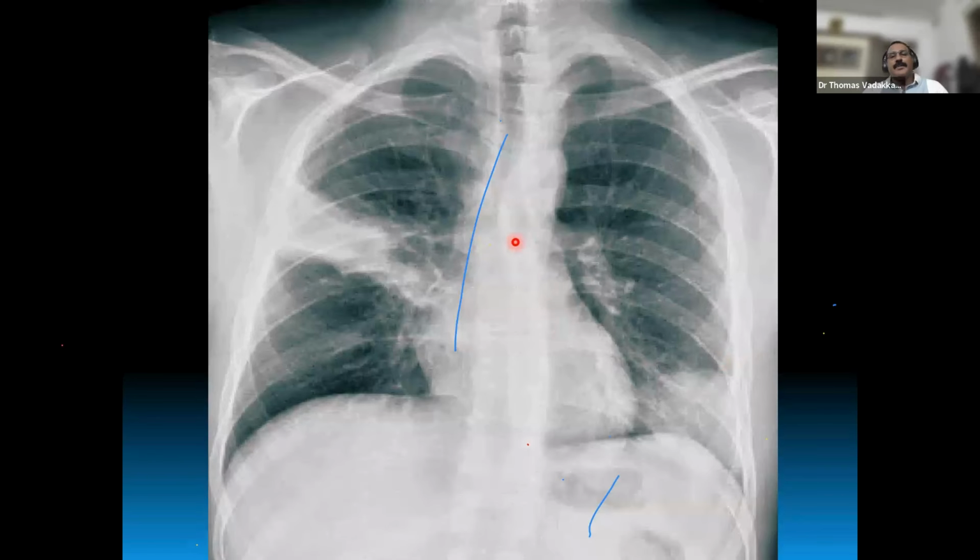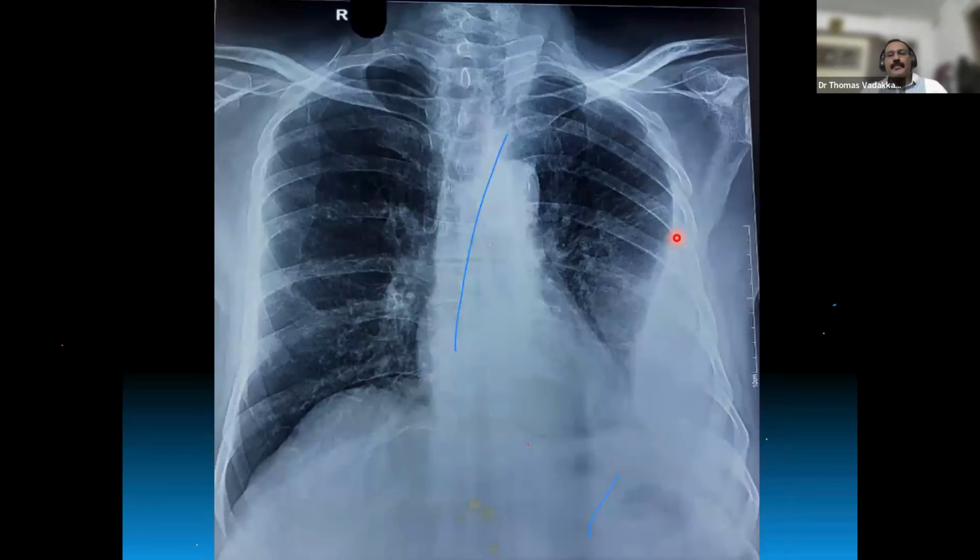This one, these are very common X-rays in your practice. You can see a patch over the right side and also the left side. So this is the bilateral pneumonia, the pneumonia occupying the right upper lobe anterior segment, and here left lower lobe. So bilateral pneumonia. Can anyone diagnose this? This is one of the simple X-rays. Yes, come on.